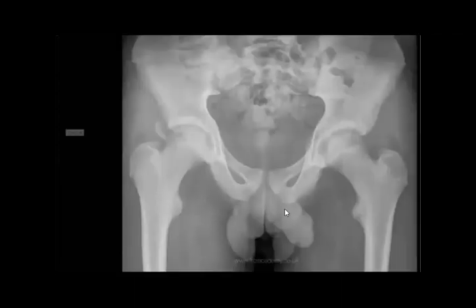Yeah, we already made this. Maybe just I will. Inferior. Yeah, you remember, inferior, right? Anterior, rectus femoris. Rectus femoris muscle. Yeah. Just I will shift to another one.